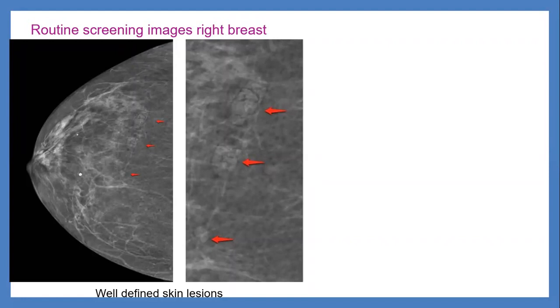That is why I was asking why that lesion is dermal. Yes, it was a dermal lesion. It was an epidermal inclusion cyst. Let me see this mammography.